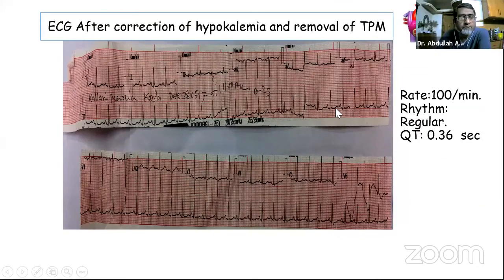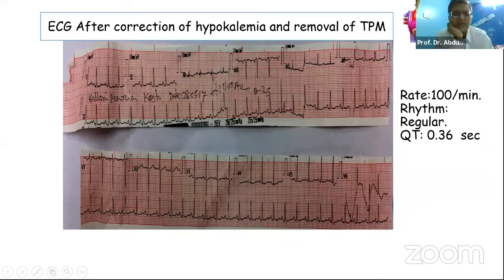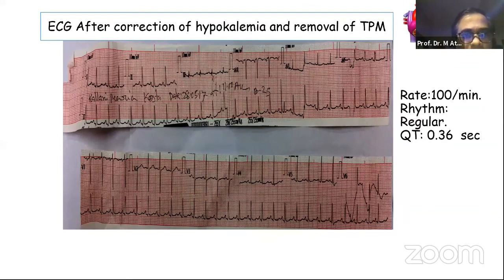No, it's 360, no? That's borderline, less than 50% of the RR interval. The absolute value is not less than 50%. Otherwise, it's more than 50% of the RR interval. No, but the rate is high. Corrected QT, corrected 360. Yeah. Next. However, improving.